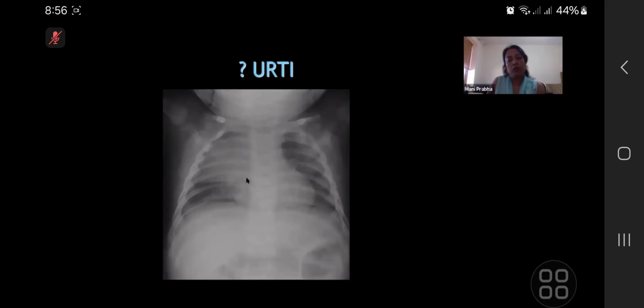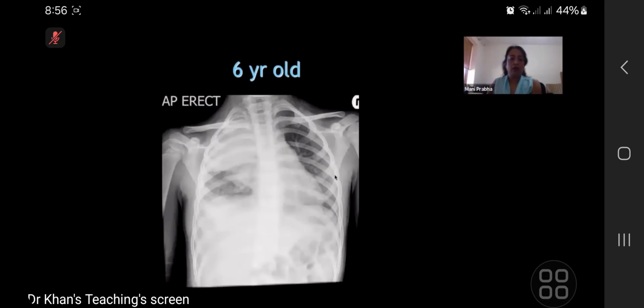Yeah, so just to sum up the findings, the mediastinum is normal, and there is some opacification in the right upper and middle zone, which has a very sharp outline at the bottom, and the left lung is absolutely clear, the right lower zone is absolutely clear. Okay, I'm just going to describe this one, come back to it. Let's discuss the other case.